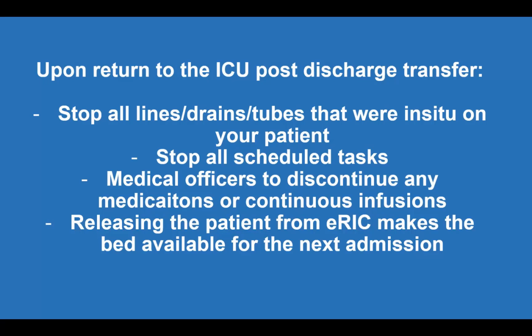Please note, upon your return to the ICU post-discharge transfer, you must stop all lines, drains, and tubes that were in situ on your patient, stop all scheduled tasks, notify medical officers to discontinue any medications or continuous infusions, and release the patient from eRIC, which makes a bed available for the next admission.